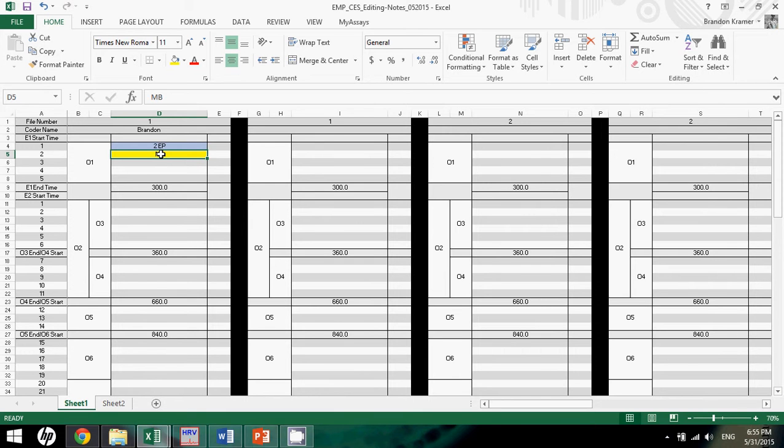Okay, now if you have more than one mid-beat in one segment, you'll always want to mark them as 2 or 3 or however many is the case. This is important because if more than 10% of the R spikes in the segment need to be mid-beated, then you'll need to take that into account.